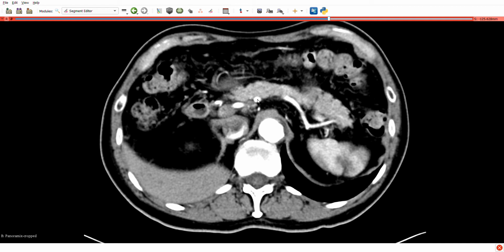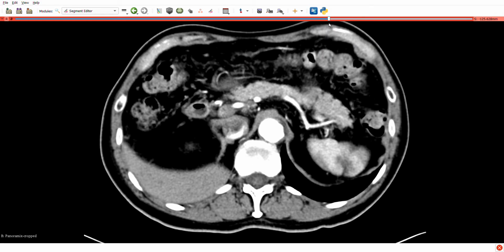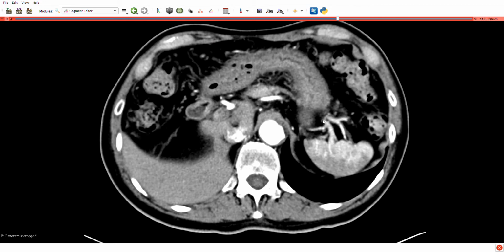On the left hand side we have the splenic artery. So once again, watch this white blob here and watch it join up with this white structure here. Okay, so here we are. Here we can see the splenic artery, and very nicely at this end we can see the splenic artery splitting into many, many branches going in through the hilum of the spleen.